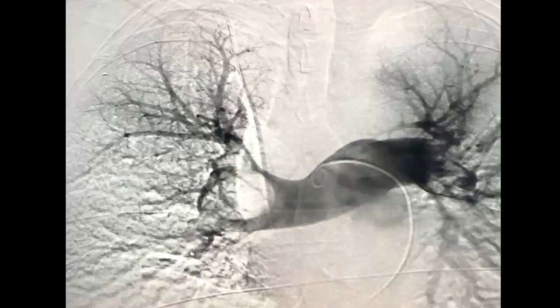So with your knowledge of pulmonary artery angiographic anatomy, tell me if you can see an abnormality. There is a narrowed segment appreciated along the right superior pulmonary artery. That is all I can appreciate. Okay, very good. Anything else in relation to that?